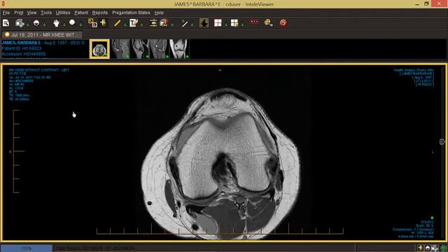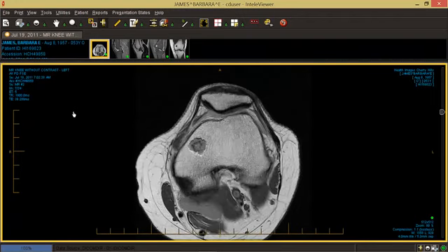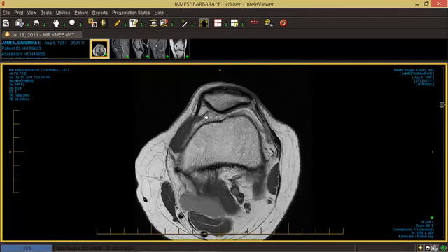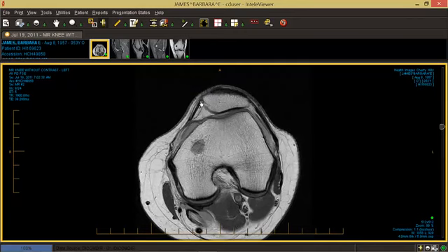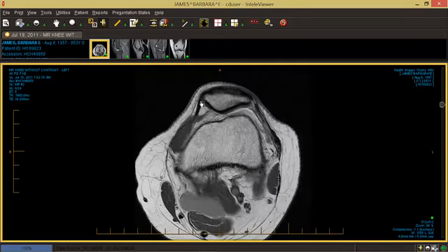And at the top-down of the axial view, one of the first things we notice as we go through it is we have up top here the kneecap, and the kneecap sits in a groove. And really, for your purposes, that's really the only thing that's going to be important about this image. Now, this particular patient has a very shallow groove. Your groove is probably deeper than this, but this patient has a very shallow groove, so this kneecap doesn't sit in a really firm groove, and it's probably going to move around a lot on this patient. You see here the lighter bone in this particular sequence, and then the darker cartilage.